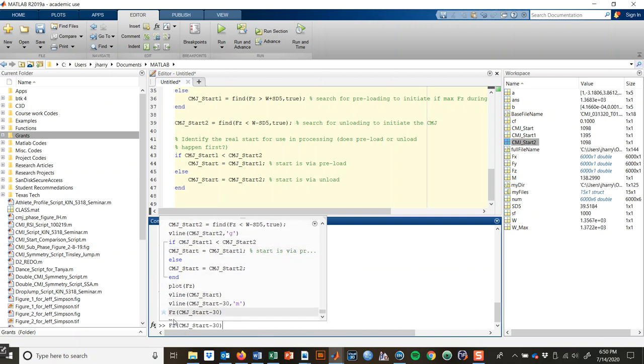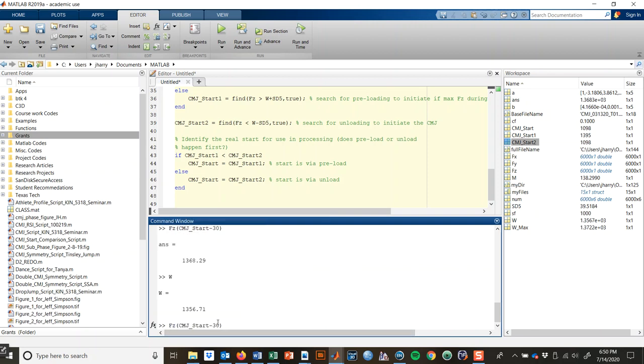So I just hit the up arrow and went to 30 here. But if I change this to 200, that is a 1363 value. And if I think of what body weight was again, 1356, we're getting much closer. Okay, so the acceleration and ultimately velocities we calculate are going to be much more precise in this case.